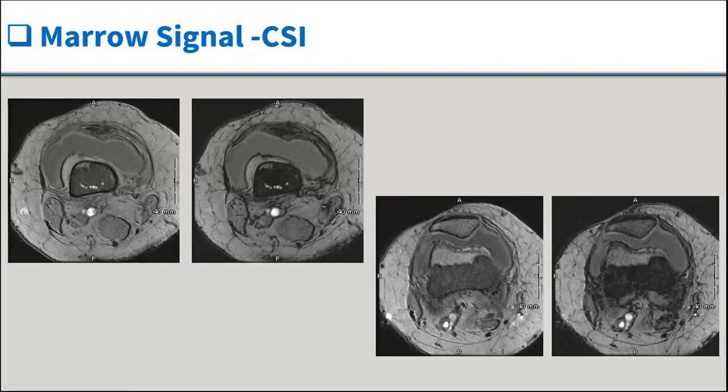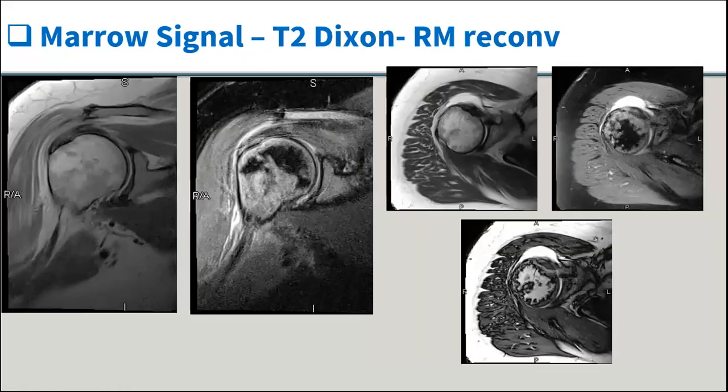So how can I avoid calling back patients who came for a joint pain and now you're suspicious of their marrow? So I put this chemical shift imaging in all the protocols. It was only a 2-minute sequence, T1 in and out of phase. Every scanner had that availability. And I tell you, in the last 6-7 years, I've never called a patient back if you have this in your protocol.